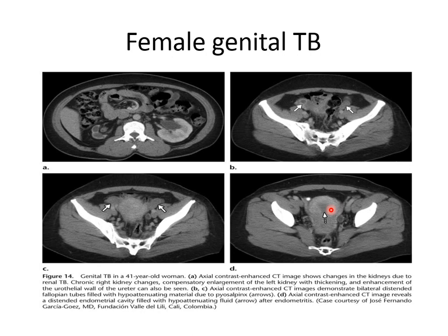About female genital TB, most of the patients present with infertility, and there is involvement of the fallopian tube. The fallopian tube will be enlarged with a thickened wall, hydrosalpinx, pyosalpinx, and scarring with stenosis. And we have the uterus, the uterine wall, the endometrium filled with heterogeneous material and a thickened wall.